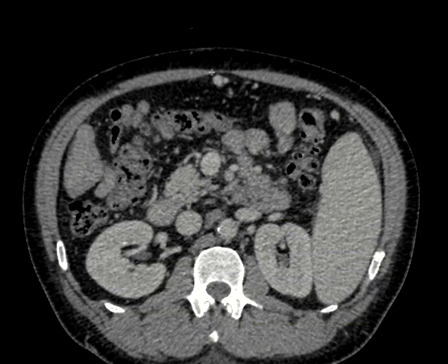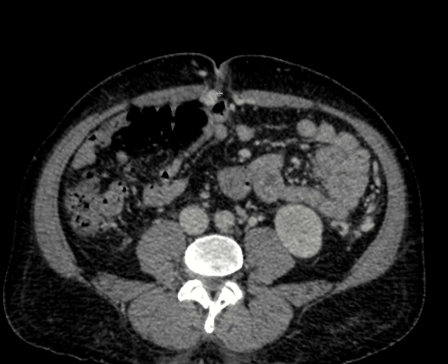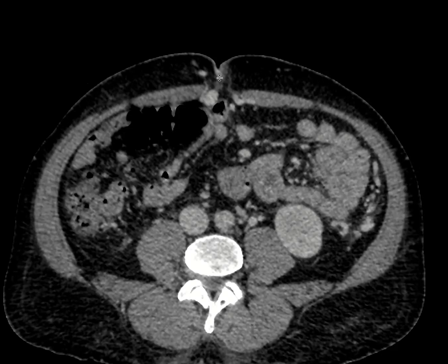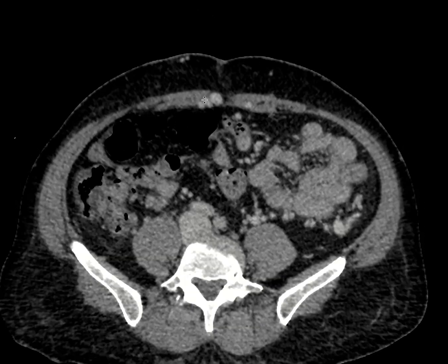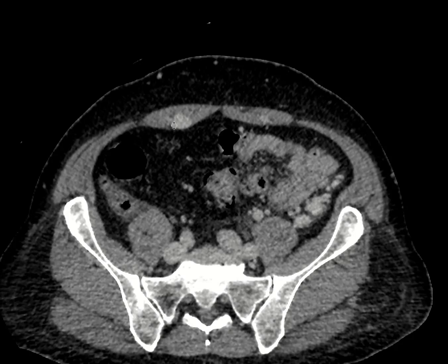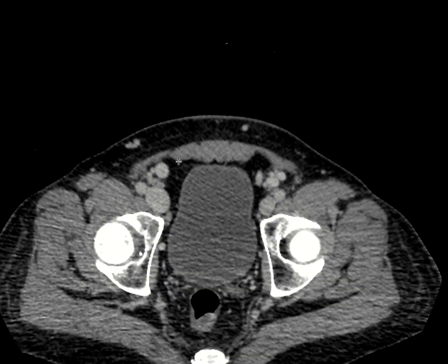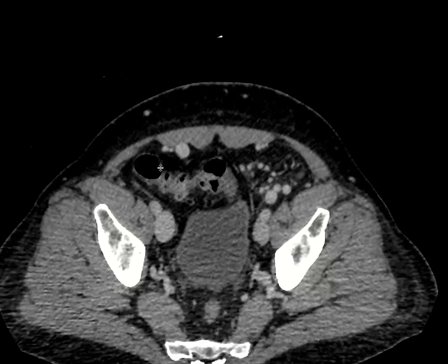This sometimes comes to the umbilicus, and so in this particular case here you can see it approaches the umbilicus, and maybe there's a small little varix coming out here, but sometimes you can see massive varices in the umbilicus, and that's called the caput medusae sign. In this particular case here, it keeps on going down and actually goes along the inferior epigastric vein and kind of follows that, and then eventually drains into the external iliac vein.